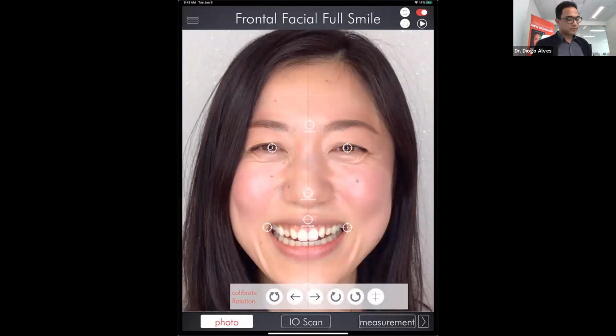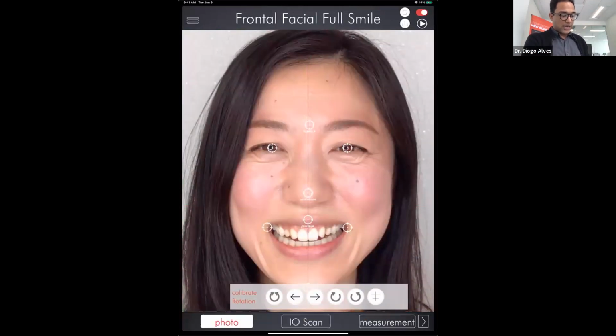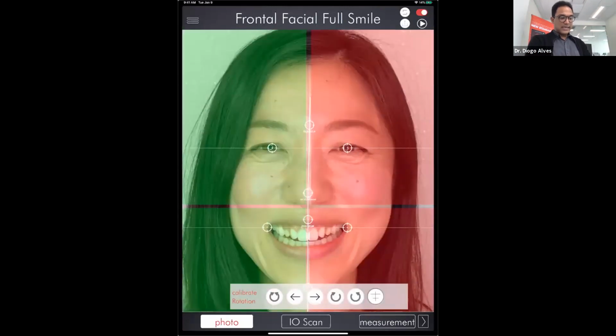and I will show you guys here. Okay. So the first step that you do is to analyze the patient's facial structure. So here, for example, what you see is that the patient's face here is not 100% symmetric. And if you notice, there is a white line right in the middle of that photo. And this line makes a slight curvature towards the patient's right side.